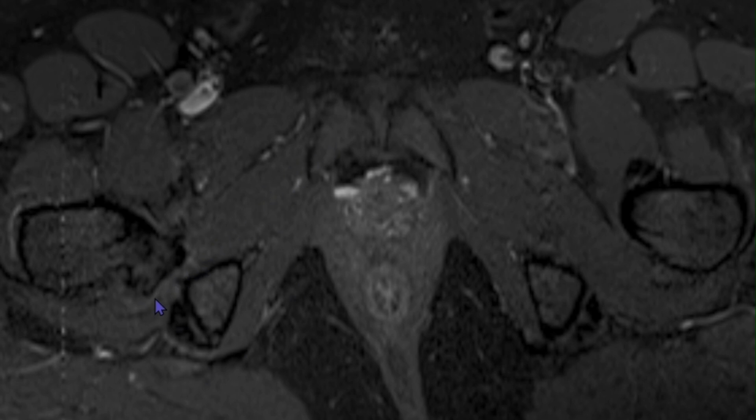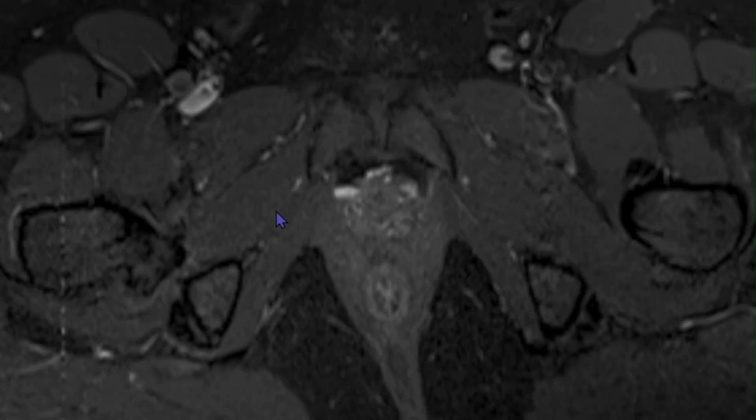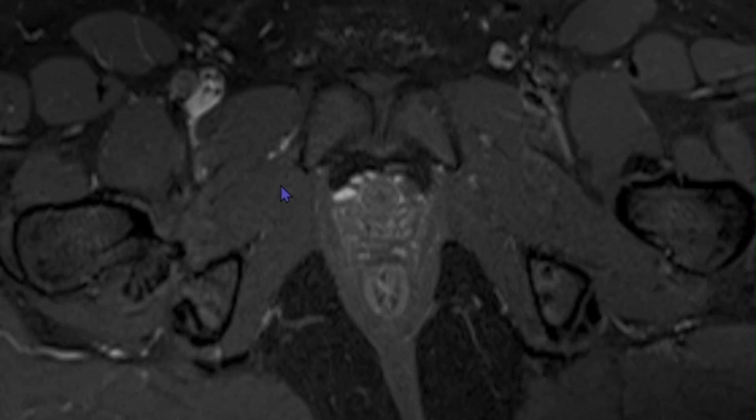So here we are seeing a reduction in the distance between the femoral neck and the ischial tuberosity. So this would be the cause of ischiofemoral impingement. Because of this impingement, there is a reduction in the distance and there is subtle edema in the muscle. So this type of pathology depends on where the osteochondroma arises. Sometimes it causes narrowing of the joint space, sometimes it causes friction, sometimes it leads to bursa formation. In this case, it is causing ischiofemoral impingement.